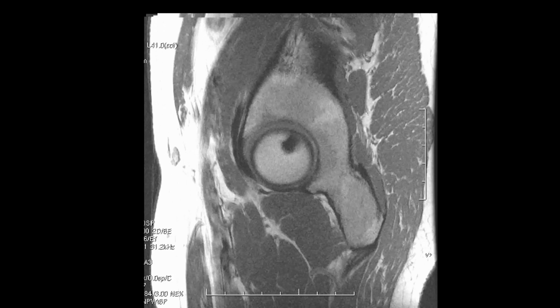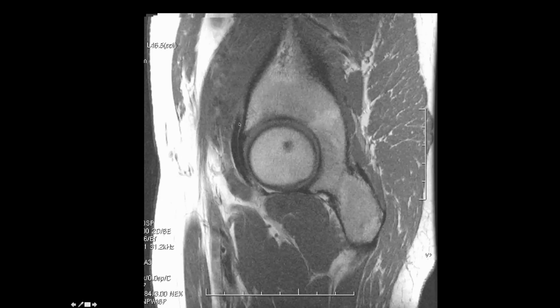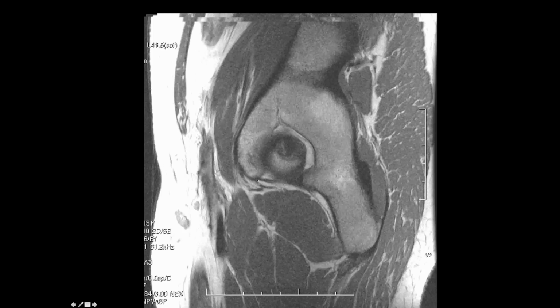On our sagittal images, we'll follow the iliopsoas complex crossing. We can see that there's both a tendon crossing the joint line as well as a muscle. Anteriorly, we can follow the iliopsoas tendon. This is the labrum, the anterior labrum, which we'll be discussing later on. And as we extend a little bit further laterally, we see portions of the transverse acetabular ligament. This is the femoral head. This is the fovea. This is where the ligamentum teres femoris will travel.